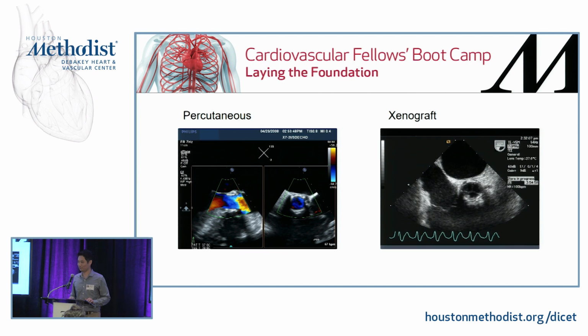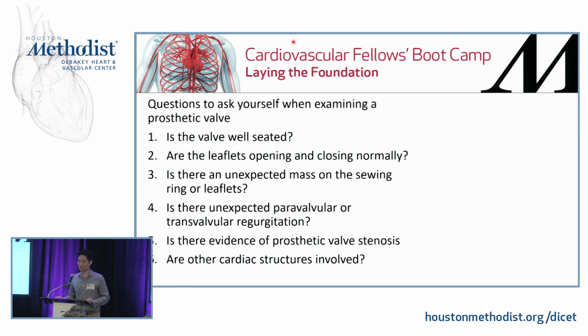So these are the questions that you should ask yourself every time you're looking at a valve. If you haven't paid attention at all to this talk, this is really one of the key slides here, okay? 6 questions you ask yourself. Is this valve well seated? So is it in a good place? Is it not moving around? If the valve is rocking back and forth, obviously that's bad because the ring can be dehisced, something like that. So take a look at the valve, make sure that it's seated well.